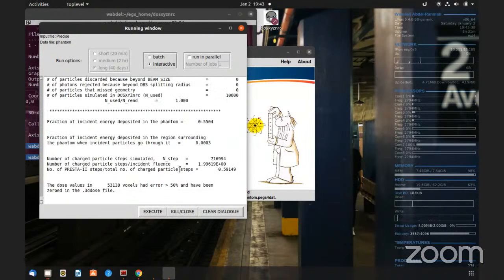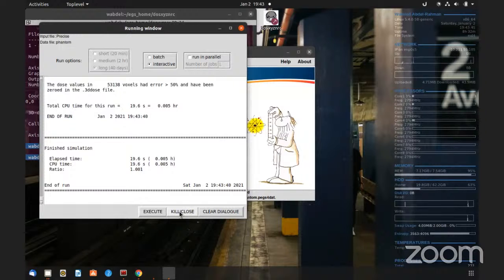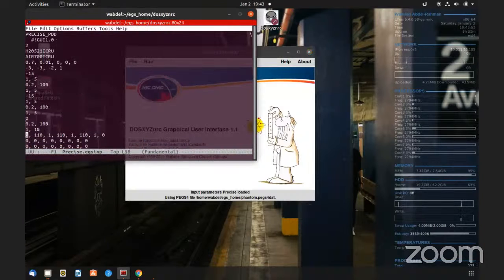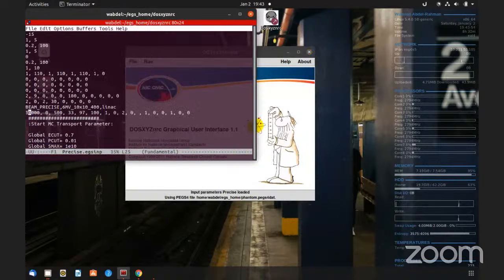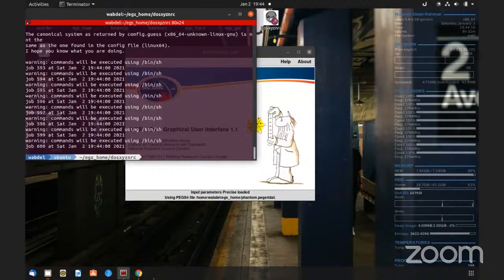Yeah, for sure there is something deposited, but I'm worried because especially we're doing a small resolution. That's why we're not seeing something in the center. So I would put here a million. Okay.